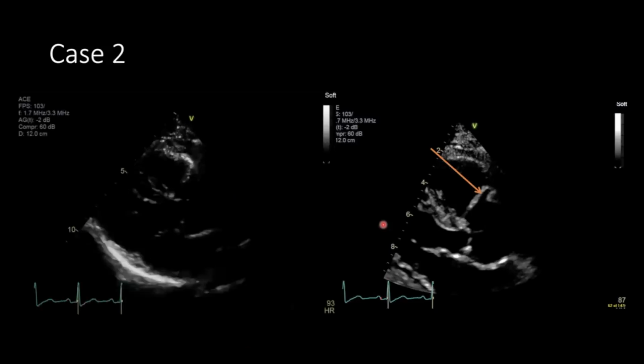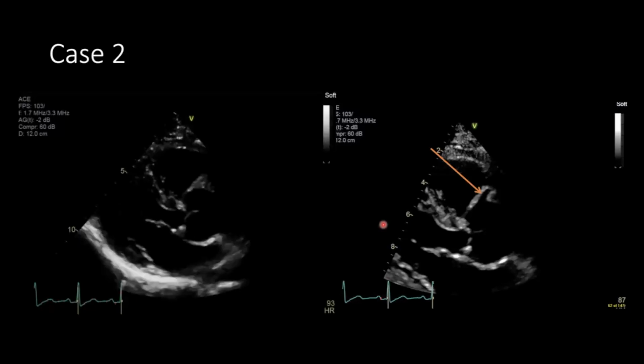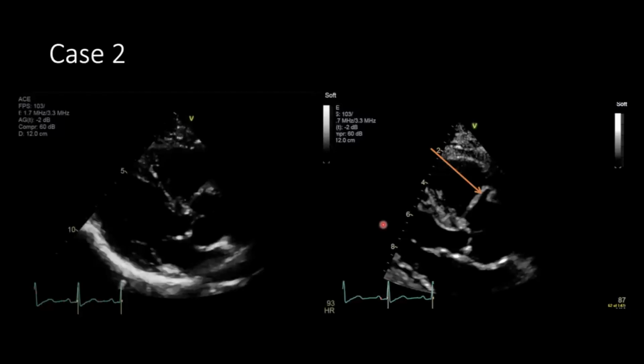Video on the left side, just a still image of that on the right side with an arrow pointing at what I'm interested in. The gain is a little bit lower, so it's a little bit challenging to see. I don't know if we can turn off just these lights. It might be a little bit easier to see. Okay, there we go. So that's what I'm interested in knowing, if you think that's a fact or an artifact.